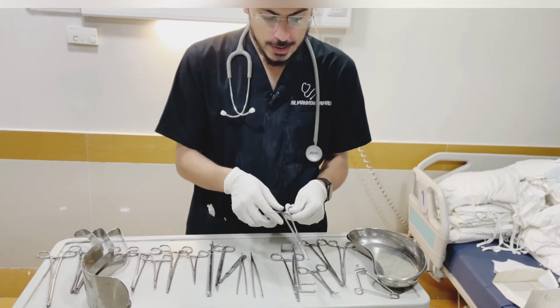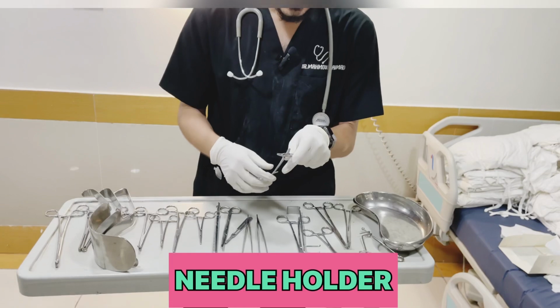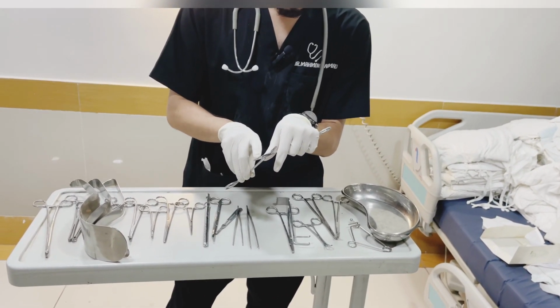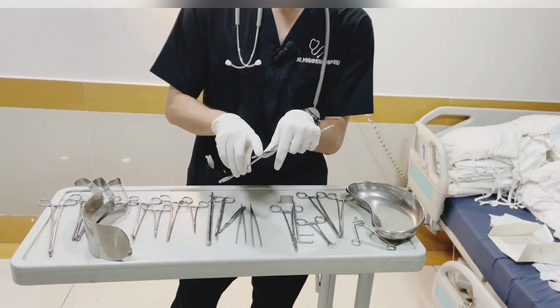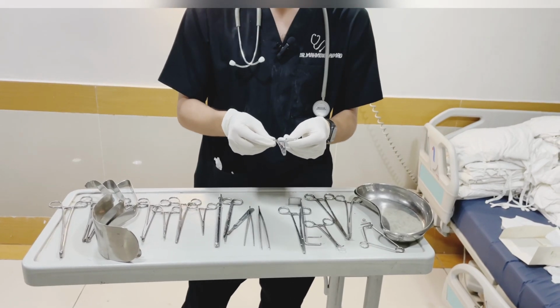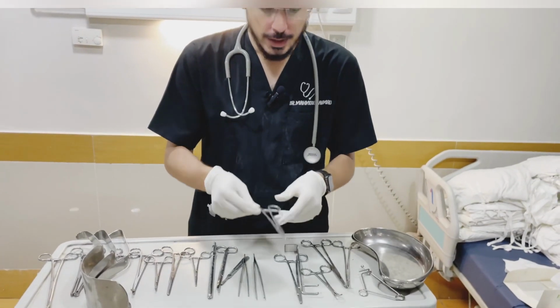Now this is known as the needle holder. How will you identify the needle holder? By just looking at the horizontal line over the continuous vertical lines. So this is known as the needle holder. It is usually used for suturing with a needle.